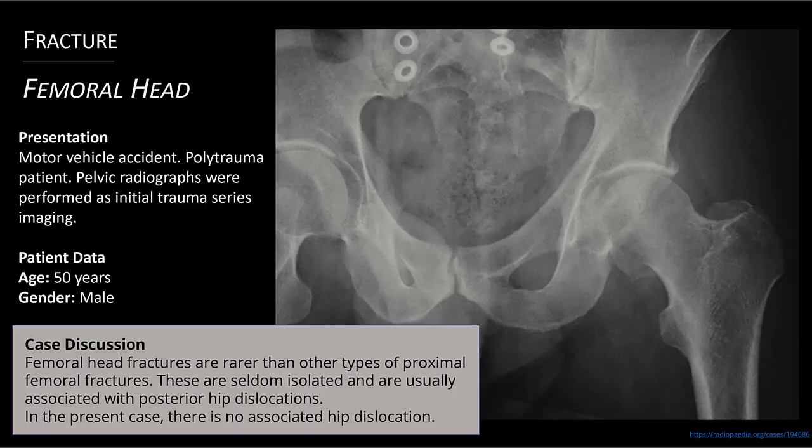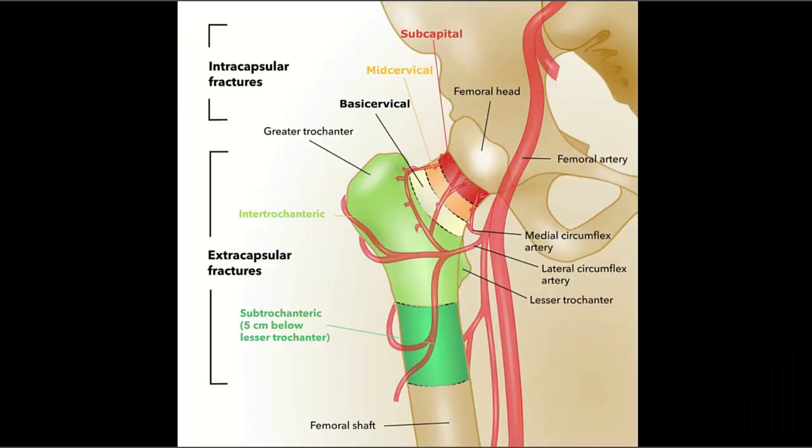See the nice round head of the undamaged right femur? Well, this really highlights the region of damage on the left femur in this patient. Finally, here's an anatomy reminder of the vascular supply to this region, which can be dramatically affected if the fracture is displaced. The greater the displacement, the greater the risk of vascular disruption. The medial circumflex artery off the femoral artery is the most predominant blood supply to the head of the femur. There's also a small minor artery directly to the head called the foveal artery, which comes off the obturator artery.